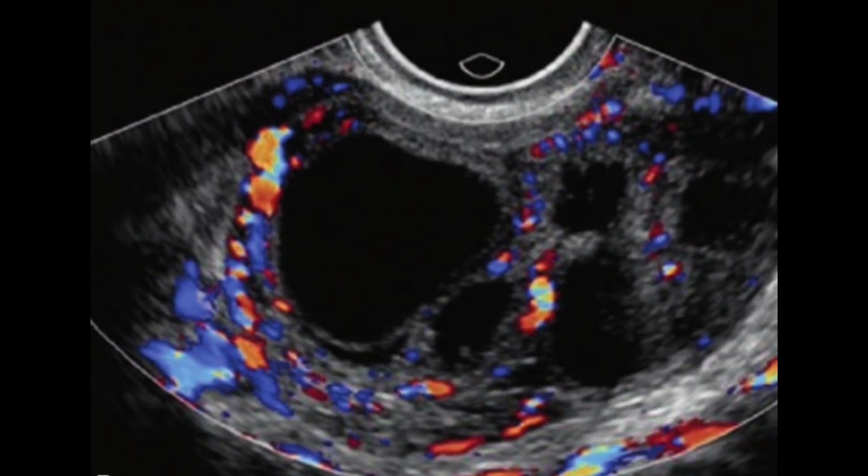predominantly cystic lesion measuring, whatever the measurement is, having thick septations, cystic spaces, irregular in shape. Give the thickness of the septa as well. It would be highly appreciated if you give the thickness of the septa. It's really very indicative, and it's an important parameter for picking up certain abnormalities. So mention that, and mention whether it is on the right or left side as well. In the conclusion, mention that the features are suggestive of tubo-ovarian abscess, a feature of progressive PID.